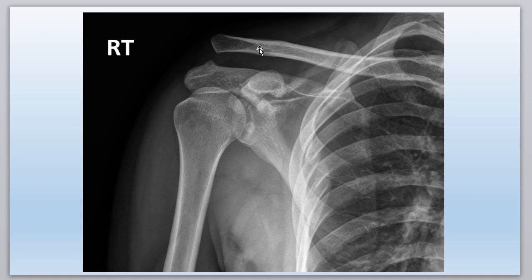Here's a clavicle again. Here's the acromial process. See something wrong here? Remember I told you in the lab how the clavicle is kind of spring-loaded? And if you rip these ligaments, what happens? It boing, it pops up. So this is a severe AC separation, acromioclavicular ligament sprain. Probably the most severe type. I won't get into the grading system. So we have a severe AC sprain. Let's check the humerus for any fractures, right? Any lucent lines. Looks pretty good.